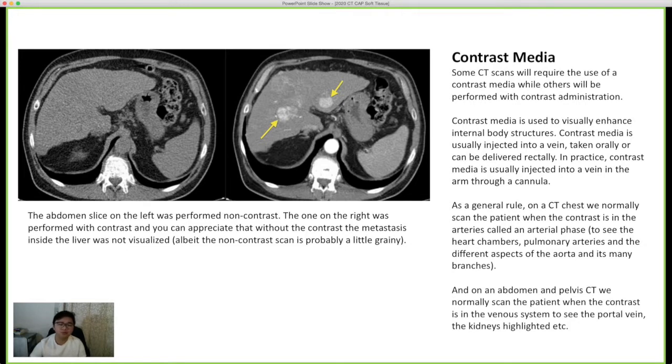In this example, the aorta is in the middle here, and we can see it really bright and really well because the contrast has mixed with the blood in this location, and it has changed the physiological attenuation. So the blood with contrast in this region has a higher Hounsfield unit because it attenuates the X-rays a lot more, as opposed to the image on the left here, where it's essentially the same location, the same structure, and you can probably make out that this is the aorta.